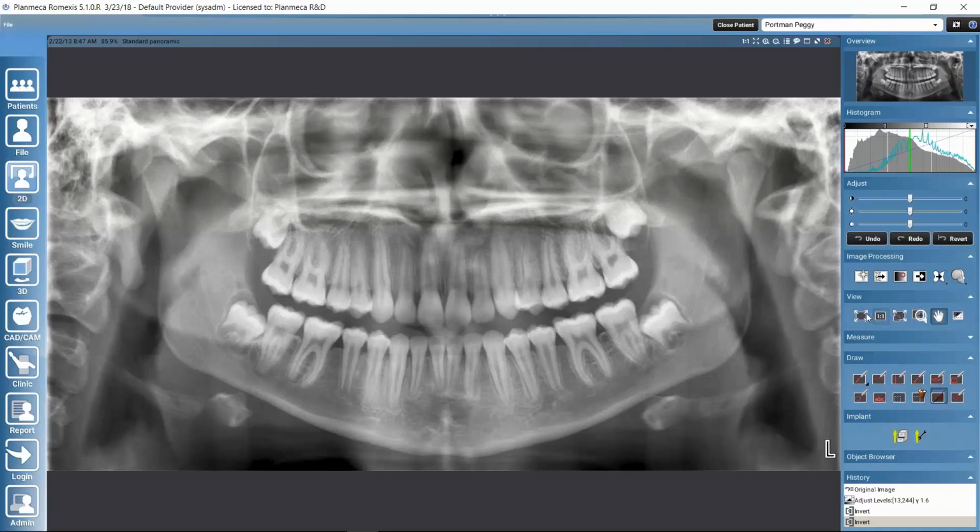Well, here we can determine a little bit how we are viewing the image. So here we have a little bit the same functions what we have also here. So we could zoom the image to fit on the screen. We could view it in actual pixels. We could scale several images to the same size.